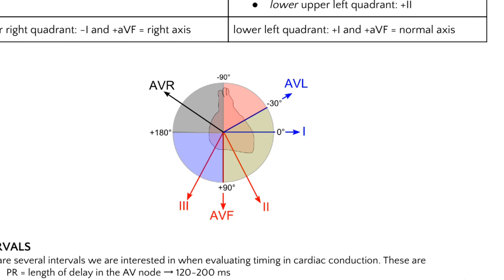And so look at this picture of a heart that's drawn here, right? So we have a heart here, and we can see that most of it, if I were to draw a picture, I'd say, it's probably there. That's probably the direction that it's in. And that's probably about 45 degrees, I would say. And we want to look at this and try to determine the axis.